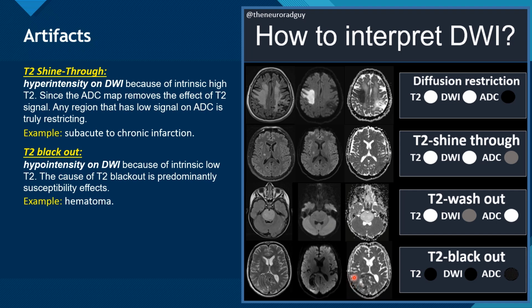Small area of brightness, small area of darkness, so it can be iso, dark, or high according to the slope of the curve within this tissue.